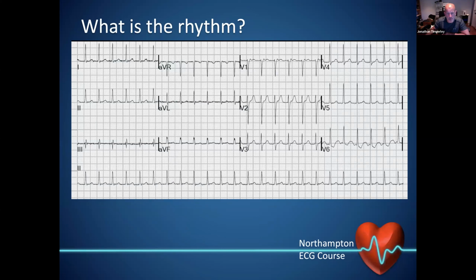I'm not going to do that at this point, but here we can see we have this pseudo R wave just visible in the tail of the QRS for the T wave, and in fact that was not present at rest. This really does tell you that this is an AVNRT that is occurring, and this little pseudo R wave here is a nice little marker.